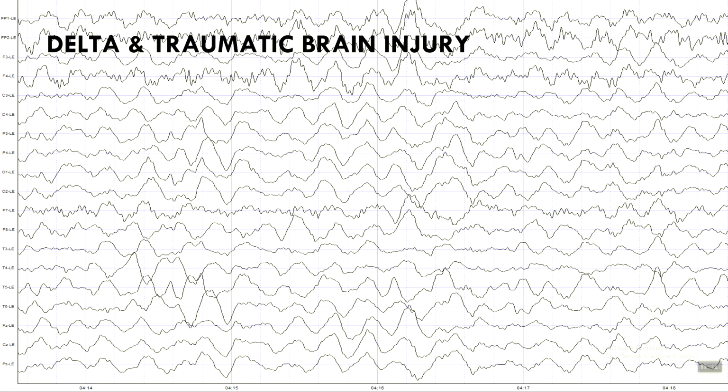And so let's talk about how to read EEG. Some of you are as green as can be, which is lovely. This is delta. This is some real big delta. So I'm going to pull out the easy, in-your-face cases. Now, how do we know it's delta?